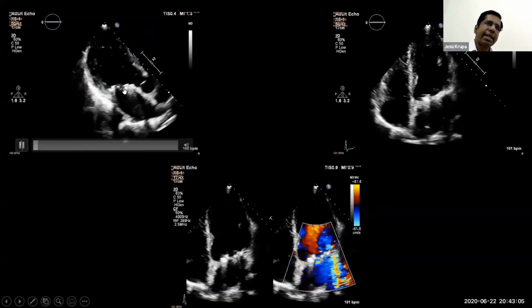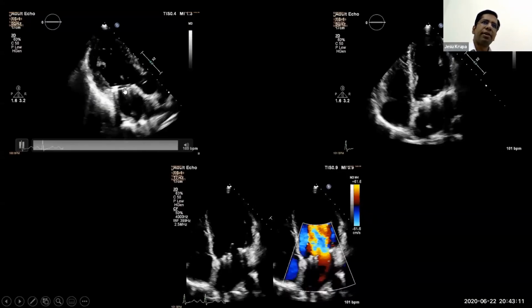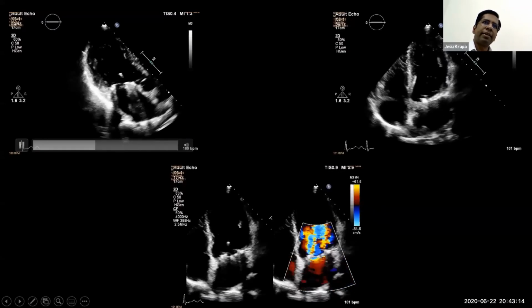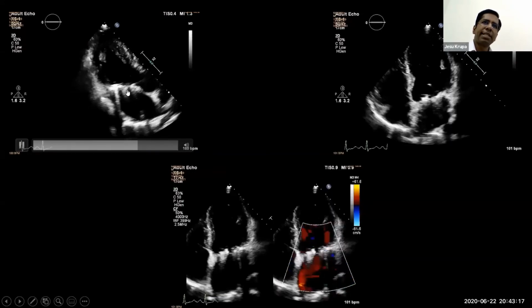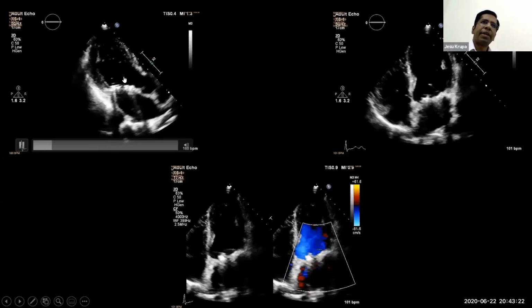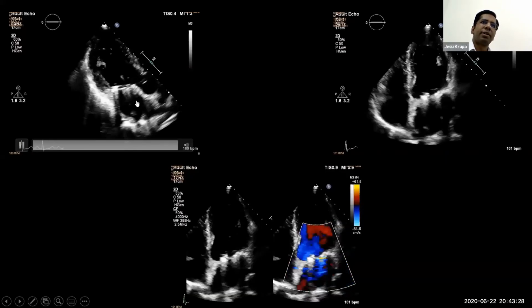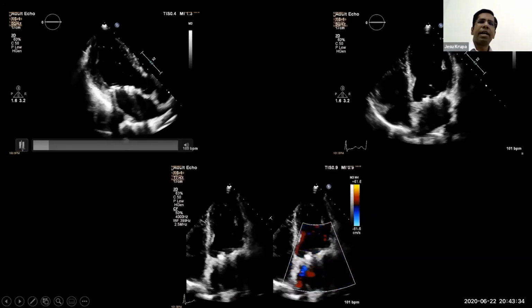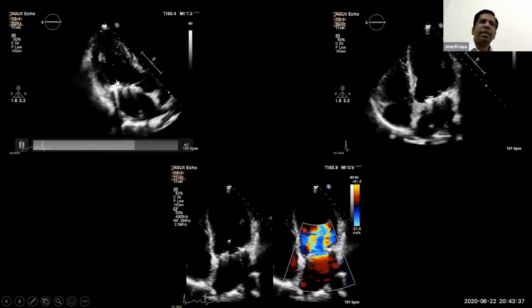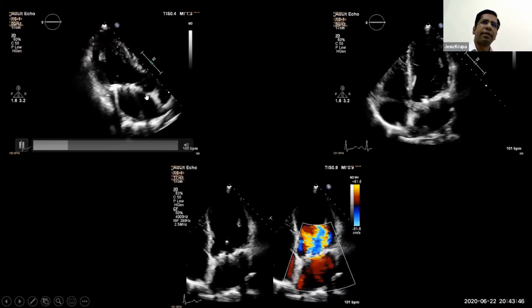I say that because sometimes when the valve becomes obstructed because of thrombus or something like that, then these bubbles also disappear. Just as valve clicks also disappear, these micro bubbles or micro cavitations, as they are called, also disappear. And they re-emerge after thrombolysis. So this reappearance of micro bubbles after thrombolysis in somebody who has had a stuck valve is also sometimes taken as an indirect sign of successful thrombolysis. So that is something to just remember.